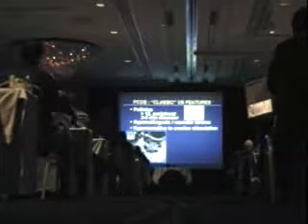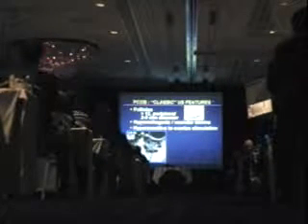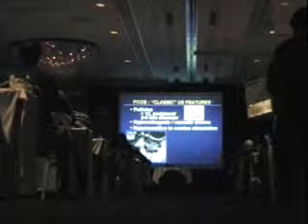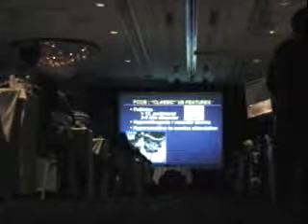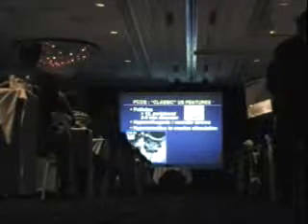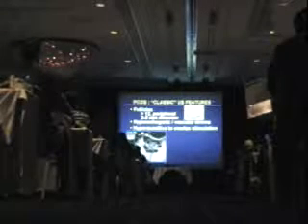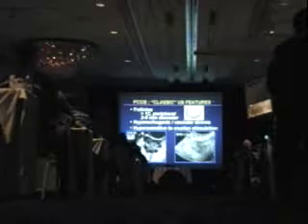And the reason we often scan these women isn't so much for the diagnosis, because clinically it's pretty well known when women have polycystic ovaries based on their clinical and endocrinological workup. It's the hypersensitivity to ovarian stimulation. As these women try to get pregnant and are manipulated, we often will follow them and look at their ovaries to make sure they're not being hyperstimulated.